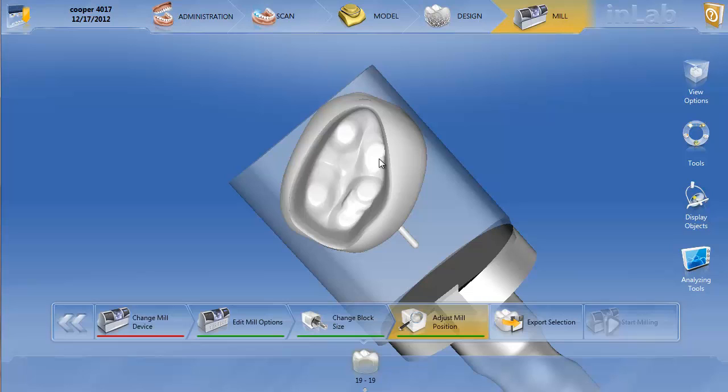You also can fix it by going and changing the shape tool and changing the margins, just something to get it to recalculate that split. Now if you've already got your abutment back from Infinident and you need to actually do this, it's only going to work where this abutment split file will fit your abutment if you did not make any changes. If you did make some changes, the abutments reflect those changes, then simply recalculating is not going to give you a crown that fits that abutment.